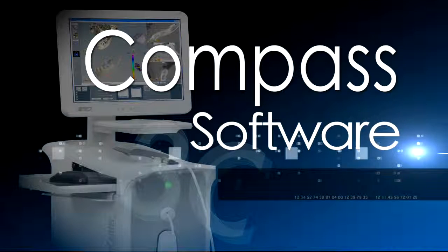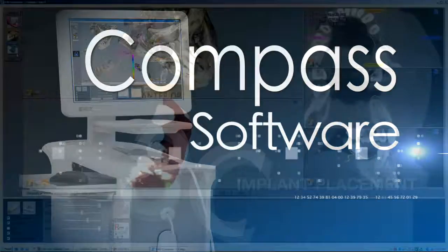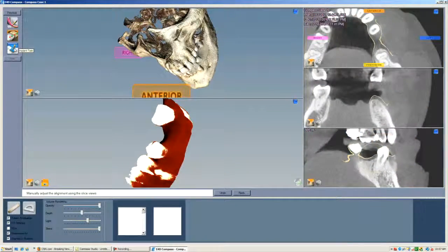We're going to join Glenn Freeman as he shows us how to utilize the features in the software in order to verify proper placement for our implants. Next, we go to our final screen, which is our implant task.